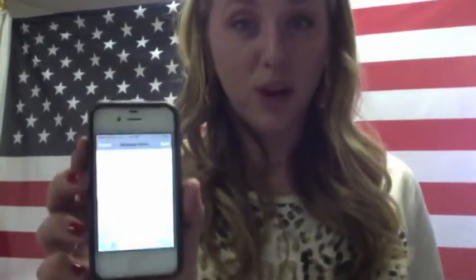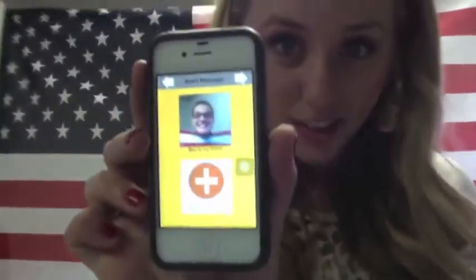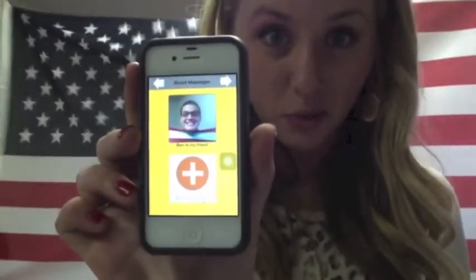And then we are done. Message name: Ben is my friend. This way the student has a picture prompt as well as a word prompt to let them know what this button means.